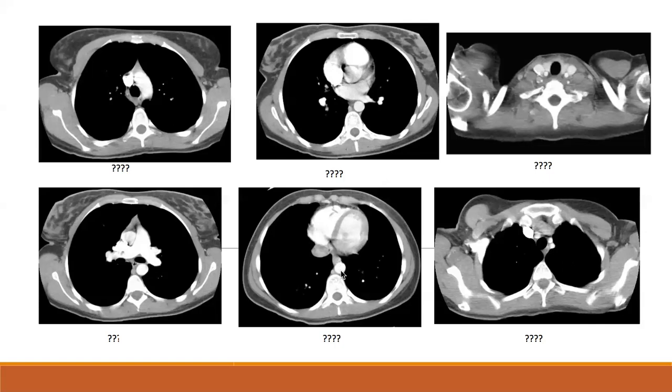You can see the descending aorta, you can see the esophagus and the azygos once more, and then you can see the two ventricles. Once again, it's pretty easy to tell which ventricle is which because the heart is going to be pointing to the left, so this is your left ventricle, and your right ventricle is always going to be your most anterior chamber of the heart. This vessel, of course, would be the inferior vena cava because we are approaching sort of from the bottom of the heart.